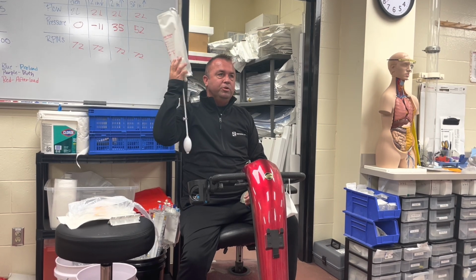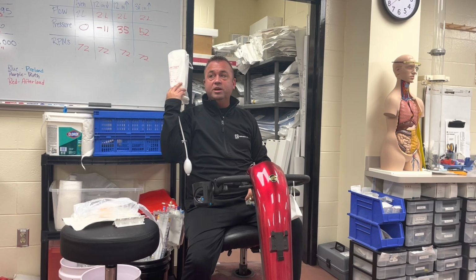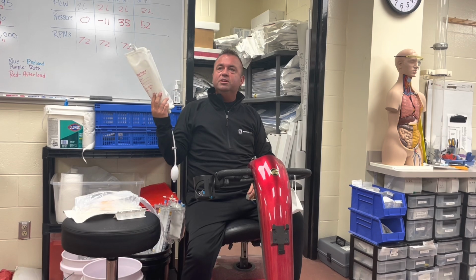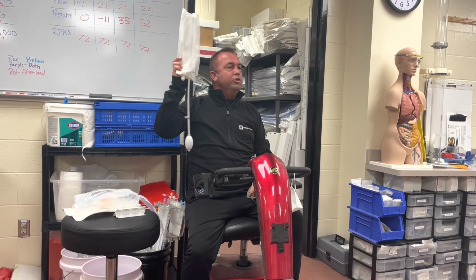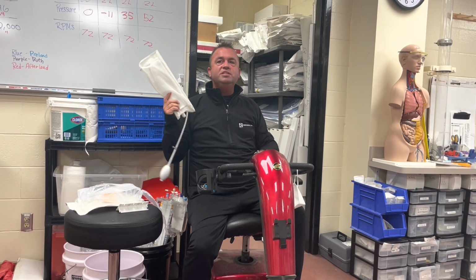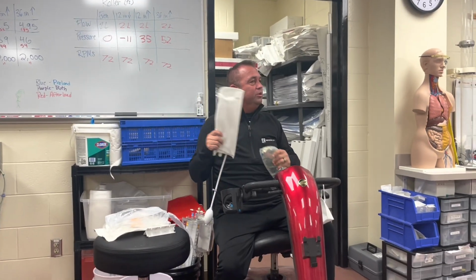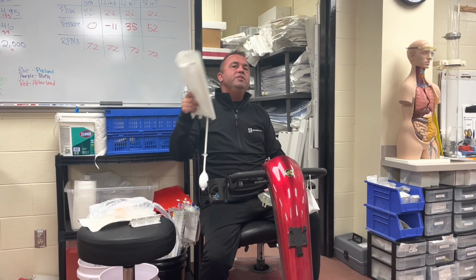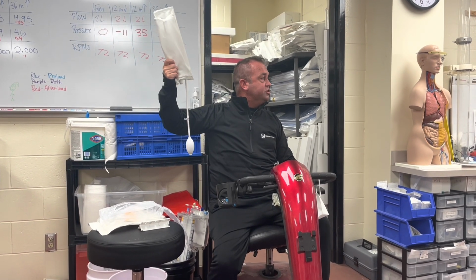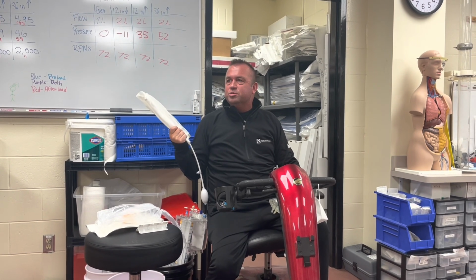Do you guys think people throw these away after every single use for the most part? I'll tell you, if you're at a hospital and they see you throw this away after one use, they'll get on your case, because these are a little bit expensive for something that gets thrown away every single time. When do you throw these away? You'll throw these away if they start to get ripped a little bit, or if you see them visibly soiled in any way. Generally, they're off and away from the table, or maybe you'll have one on your blower mister on a column where your CO2 comes for blowing CO2 into a valve or the chest. They're not really close to a sterile area.